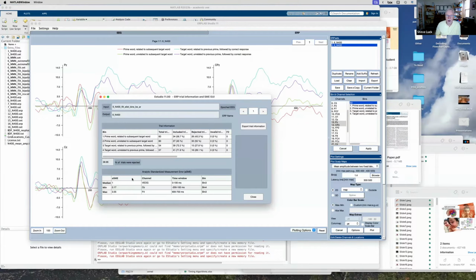And these numbers probably don't make any sense to you right now. But once you've done this for a while and you get used to what's normal, you're going to notice, oh, this value is 35. Usually I'm seeing values of about 3 to 4 or 5. Something's going wrong here. So this is just a quick and dirty way of seeing, is there something wrong with your data in terms of the data quality?